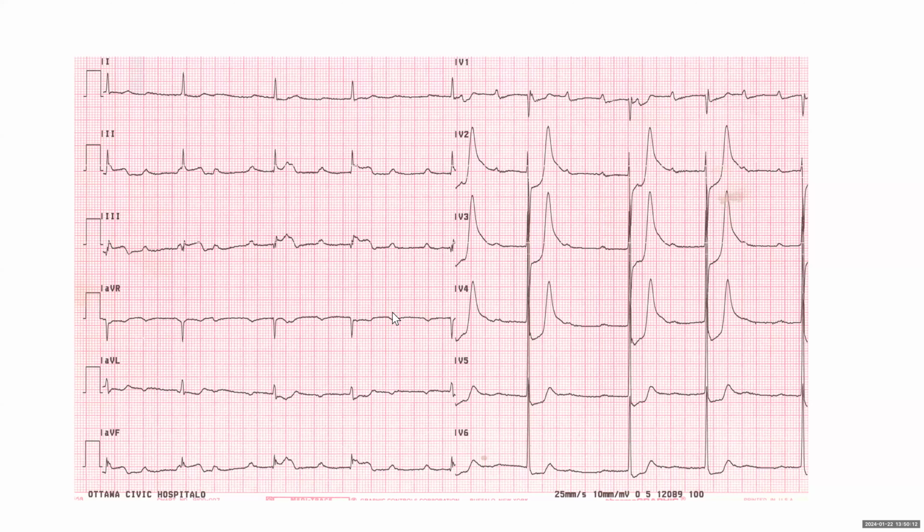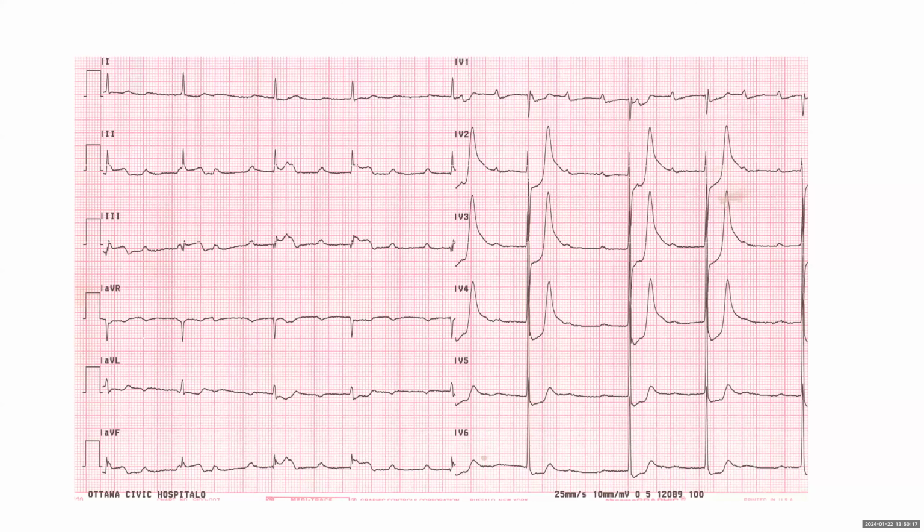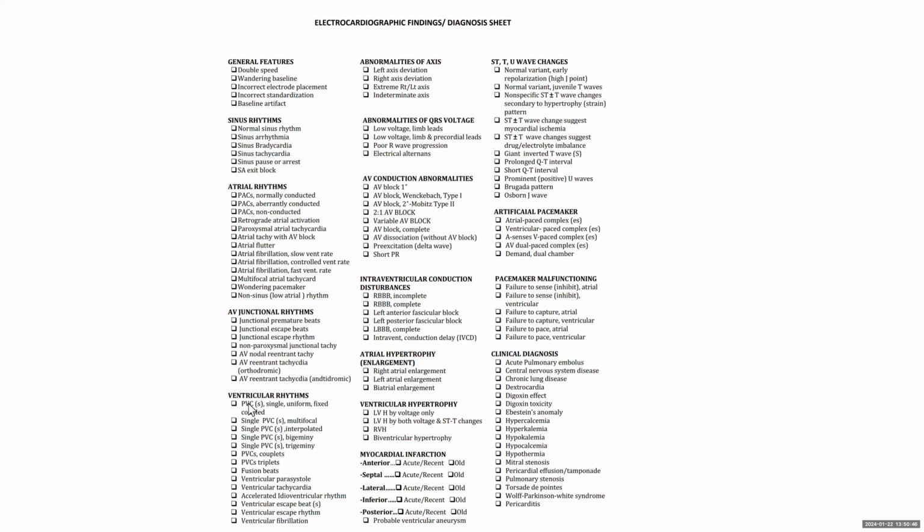Okay. Moving on to the next ECG. Why is the culprit circ, not RCA? I don't want to make this a point. This is not for the exam. I would just say I'm trying to teach a point about the mechanism of AV block: in RCA it is often high vagal tone, not ischemia. You can have ischemia, but it's more common with left circ. That's all. Okay. Next ECG.